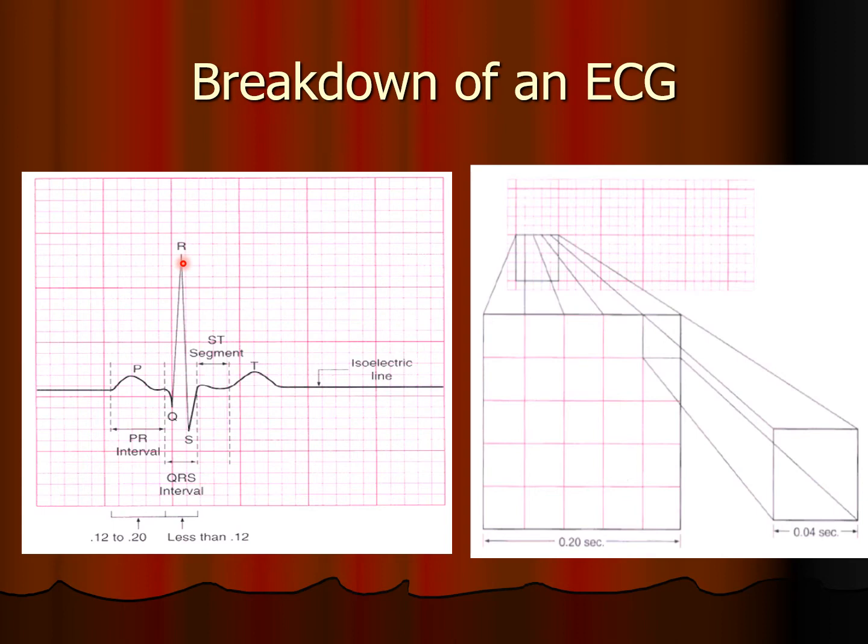All right. Now, the ventricles are big, right? They're pretty darn big. So see how much larger this is than this? That's why. But we have a lot more fibers and a lot more conduction going on, so it shouldn't take too long for the information to travel through the ventricles. So ideally, we're looking at the entire QRS to be less than 3 little boxes or less than 0.12. And in some textbooks, you see less than 0.10. So we want a nice skinny QRS, right?